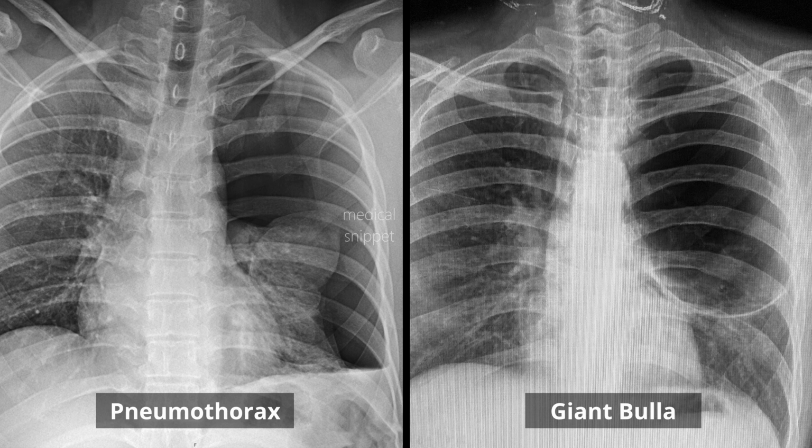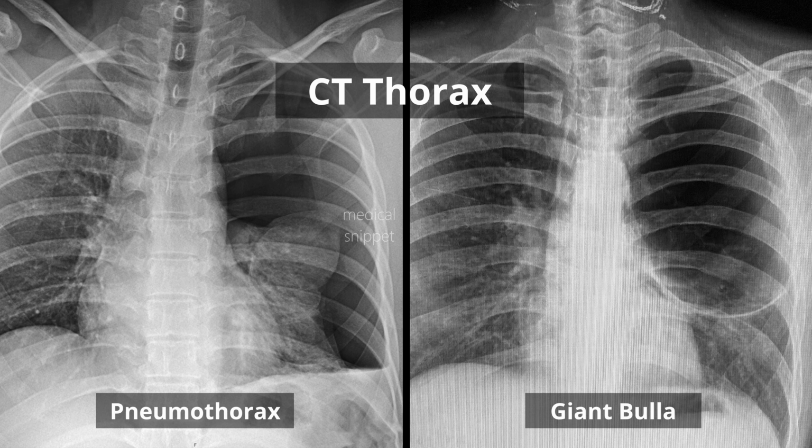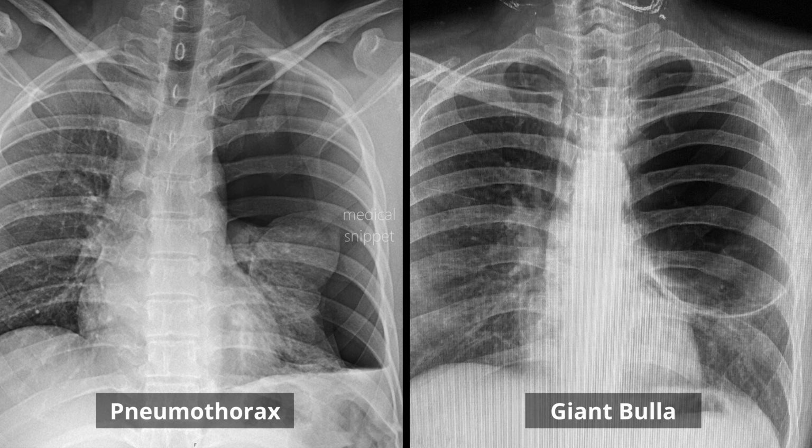If in doubt, always do a chest CT scan, as it is the gold standard to differentiate between giant bulla and pneumothorax. Why is it important to differentiate between these two conditions? The reason is the treatment of both of these conditions is totally different.